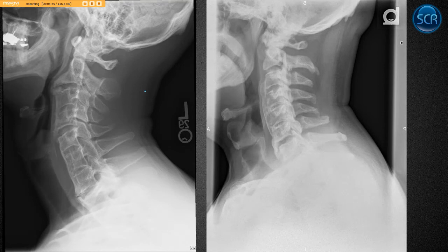Here's another similar example where we have very prominent DISH here, and then ossification of the posterior longitudinal ligament. We kind of lose, can't really tell where it ends, but definitely back here you can see there's this large calcific area. They have a little posterior ponticle here, no one cares. And we look at this AS case. This is a case of AS, very classic in the lumbar spine. Cervical spine could be a little bit trickier.